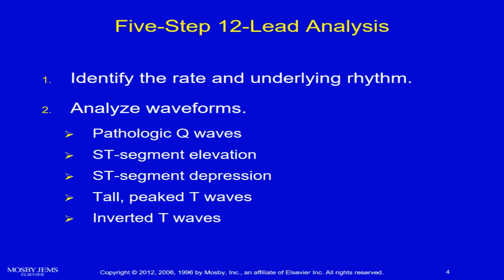So we're going to do a 5-step analysis. When you think of something you want me to explain, just tell me and we'll get it explained, all right? But it's basically identify the rate and the underlying rhythm.